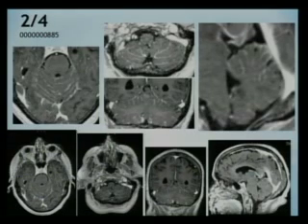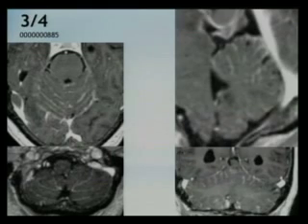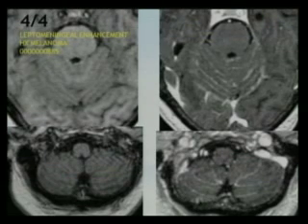Same images except magnified. The patient actually had melanoma, so even though this hasn't been proven, this was thought to be melanoma metastasis. And occasionally you can get this kind of a meningeal enhancement called sugar coating.